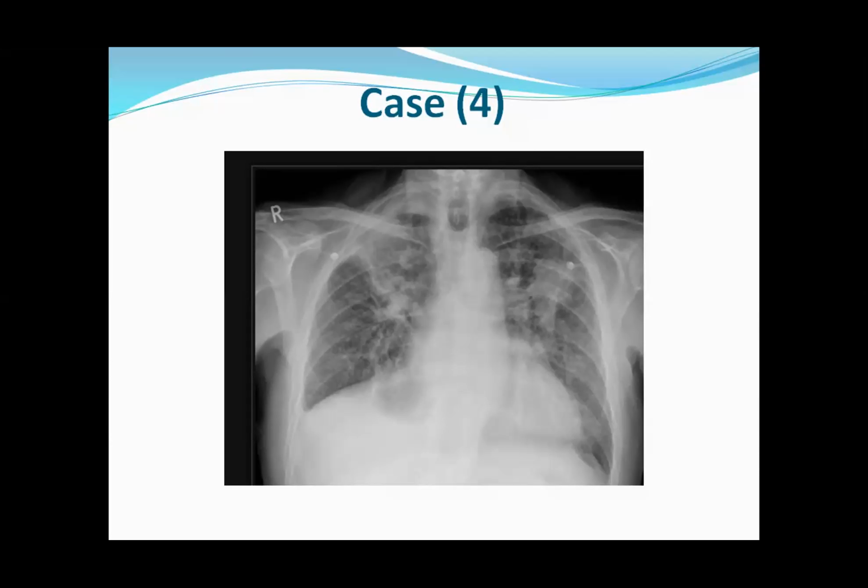In addition to these findings, there are diffuse reticular shadows noted in bilateral lung fields. I would like to retake my statement. These need not be a pleural calcification as such. So these are bilateral radiopacities in bilateral upper zones with diffuse reticular shadowing.